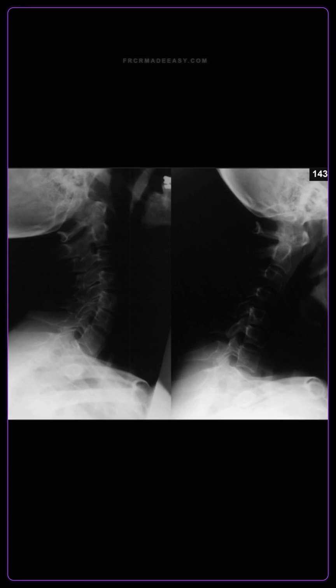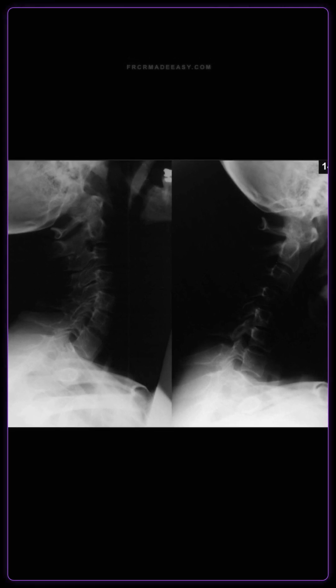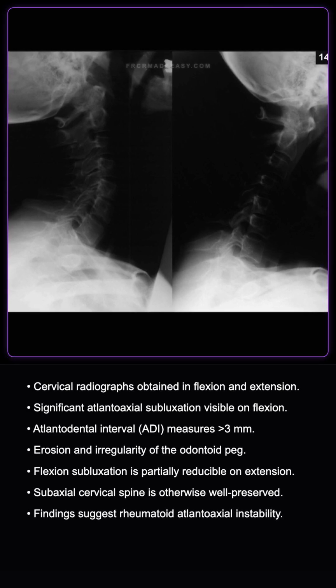A 62-year-old female presents with neck pain. I am showing you the lateral cervical spine radiographs in flexion and extension. Describe the findings. Okay, assessing the provided imaging. The lateral radiographs of the cervical spine demonstrate lateral views in flexion and extension.